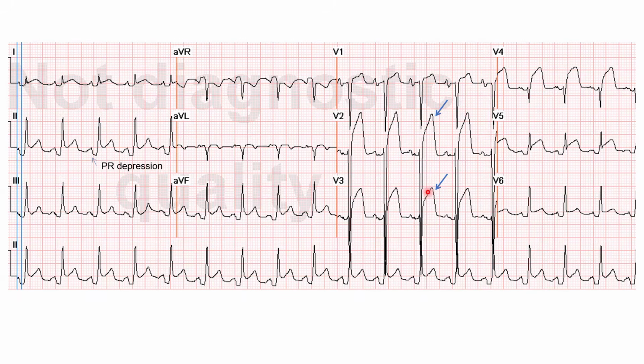In this patient, the ST elevation has a dome morphology with an upwardly convex shape and a wide and high T fused with the ST segment, very typical of STEMI. Also, the size of the ST elevation, over 5 millimeters in V2 through V4, and larger than the QRS, and the shrinking QRS in V4 is definitely suggestive of STEMI.